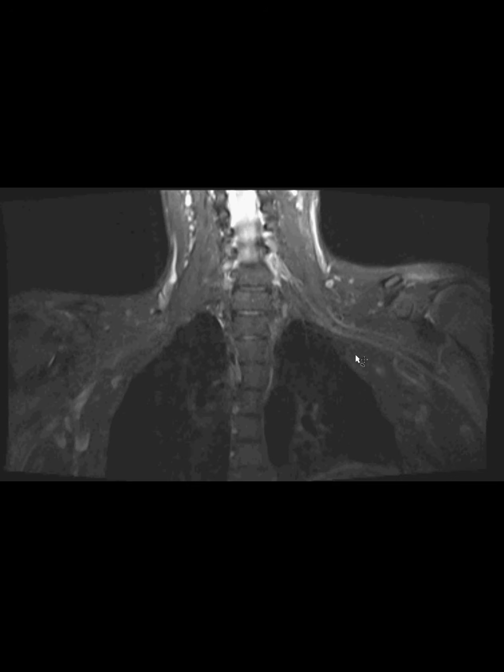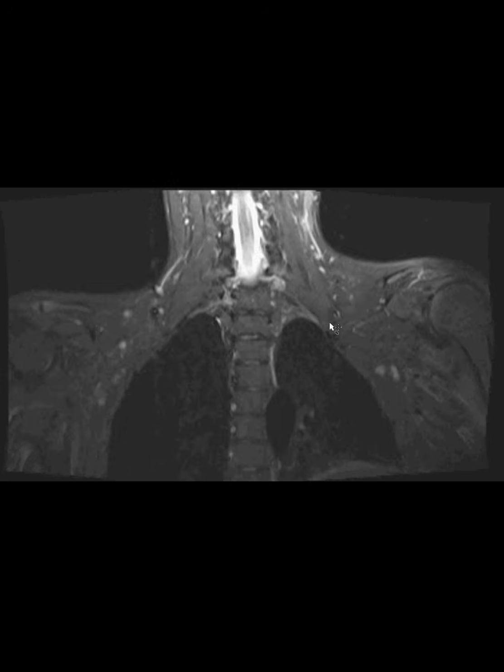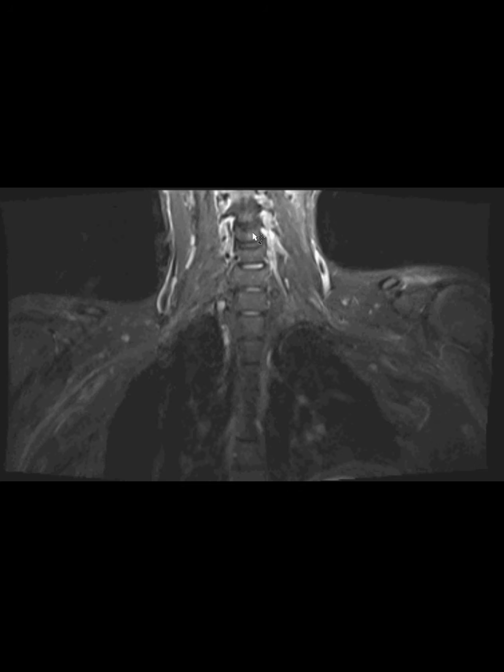But what I'd want you to see is we use a rectangular field of view, so we don't include the brain because that's not important. And even in this case where maybe this is, let's say this is T1, 7, 6, 5, there's even a little extra that's included that isn't necessary to include, but I understand it's sometimes difficult to do.